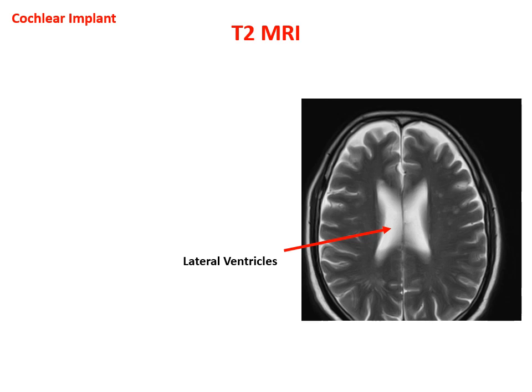Another important differentiation is to look for the white matter. We know that the white matter is deep. The gray matter is outside, the white matter is inside. And the white matter, which is deep, in T2 looks black. So these are the two main differences between T1 and T2 MRI.